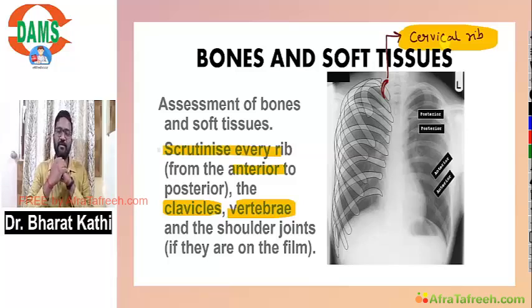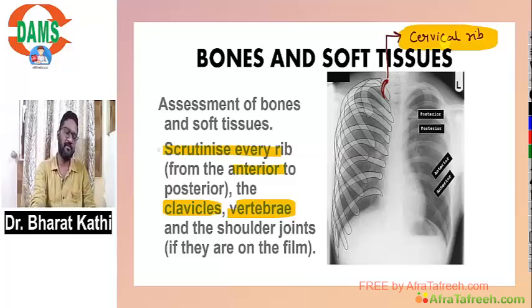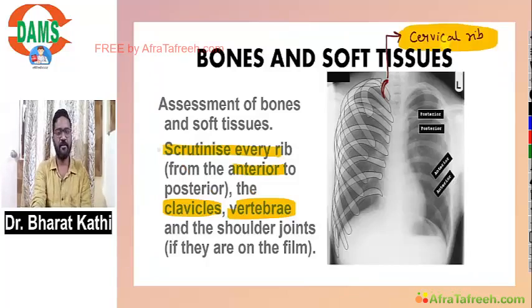So like that, with a few examiners, sometimes everything will be normal, and they will be carrying that cervical rib x-ray. Don't forget, you should also be able to recognize this abnormality. Then let us see some frequently asked chest x-rays.